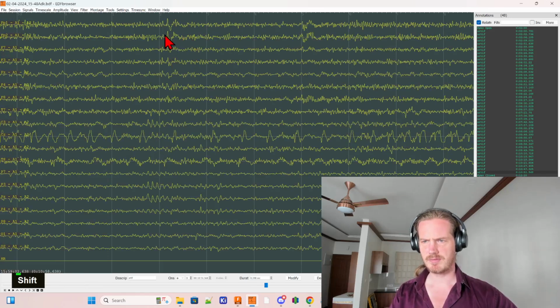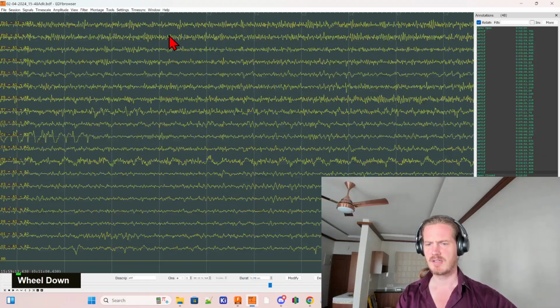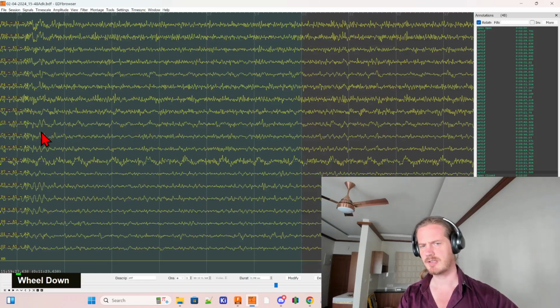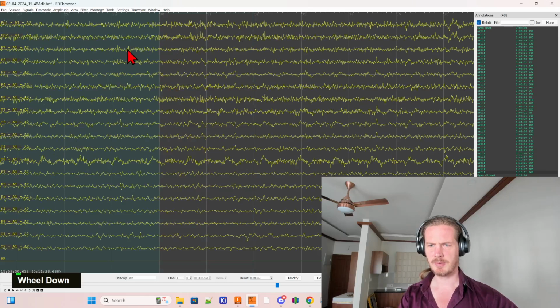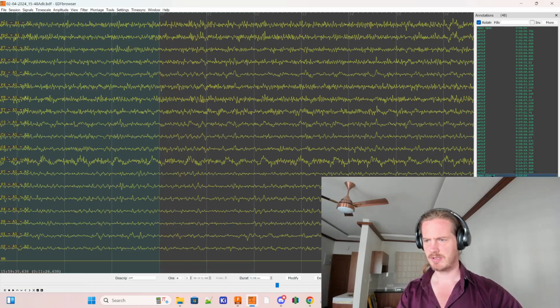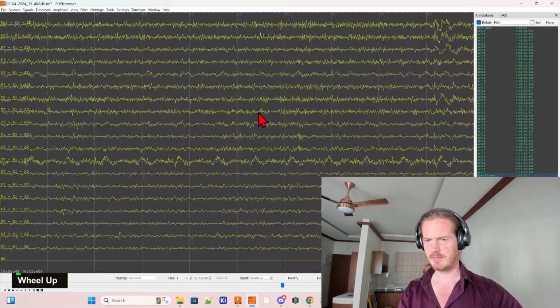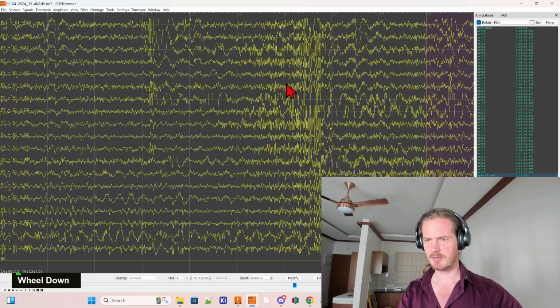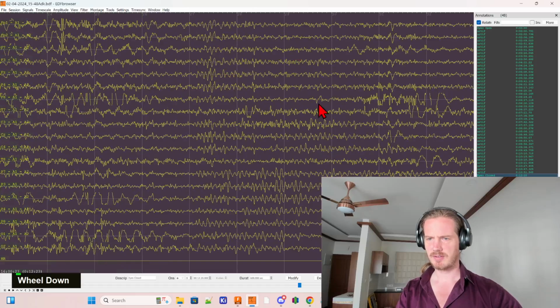Oh, this is something very slight, I'm going to leave it as is. See now that twitch that was in CZ has gone away, and we've reached the end of the eyes open period. So now I'm going to continue to the next period here by clicking eyes closed. You can see here the person was moving around, blinking the eyes a bunch of times, moving, and then they close their eyes, and this is really where it starts.